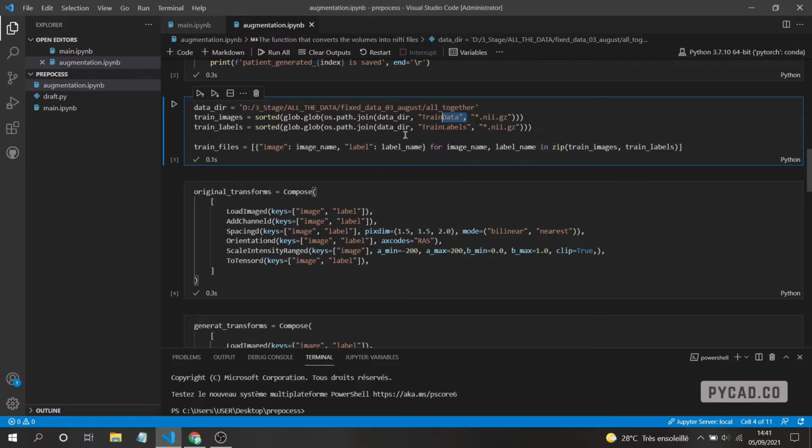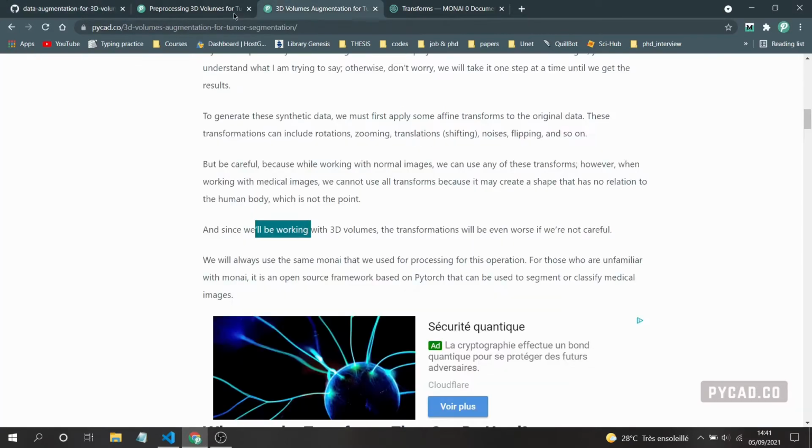All we did here is create a Python dictionary, and we put all the data that we have with the corresponding label in each row of this dictionary. There is nothing difficult in this part, but if you didn't understand what we are doing here, you can see the last video, or read the blog post about it, or the blog post for this video.